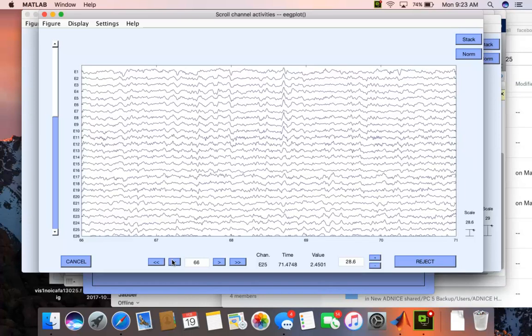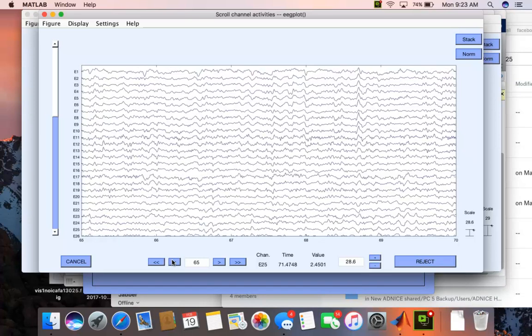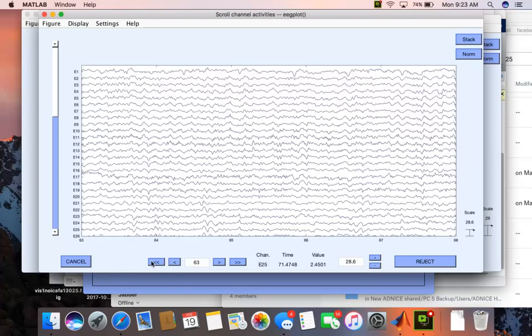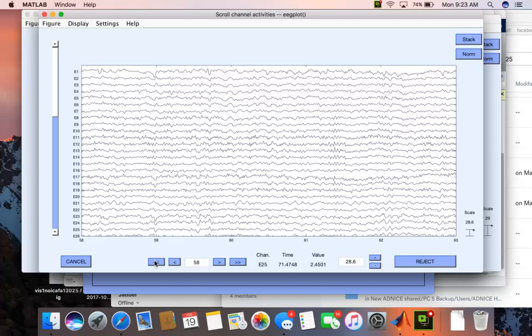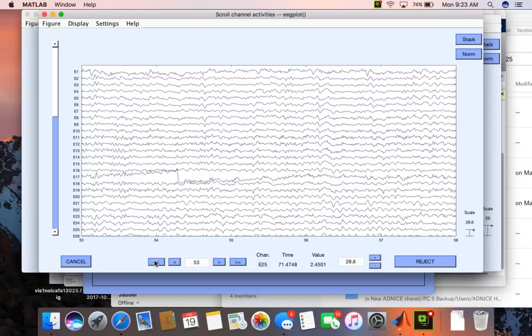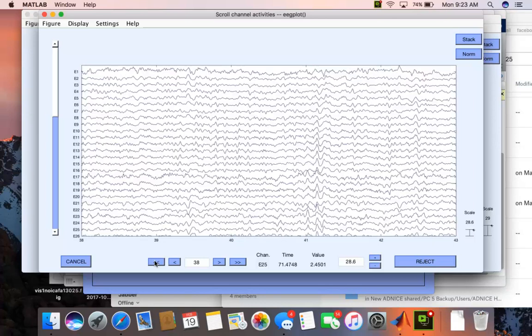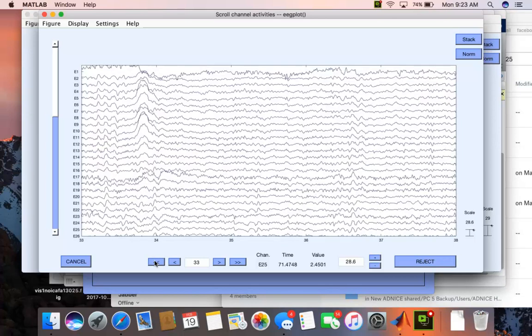So trying to figure out what to do, what are we looking for. There are people who build careers off of automatically identifying these artifacts. So they'll come into a filtered set of data like this and locate these, and you notice they're time localized. So this brings in a point about the stationarity of the data.